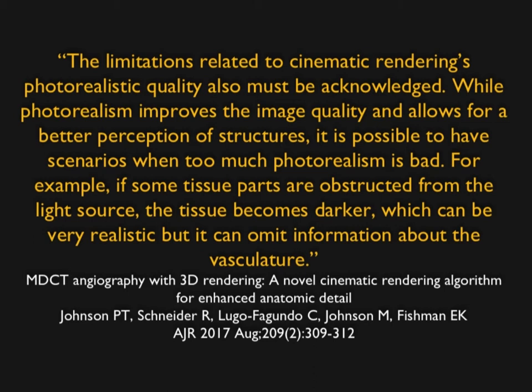Regardless of the type of 3D imaging, volume or cinematic, you always need to be careful about the accuracy of the data. We still always look at the original data sets. There are some issues if you change the lighting model. Can you obscure or confuse things? I mean, anything is theoretically possible. I can make an image that's very pretty, or I can make an image that really hides things. And there's no way to know that you have the perfect image. But we understand that because when you look at an abdominal CT, for example, you need liver windows. If you look at the chest, you need soft tissue windows and lung windows. Just simply having the wrong window width and window level is going to obscure or hide the presence of pathology.